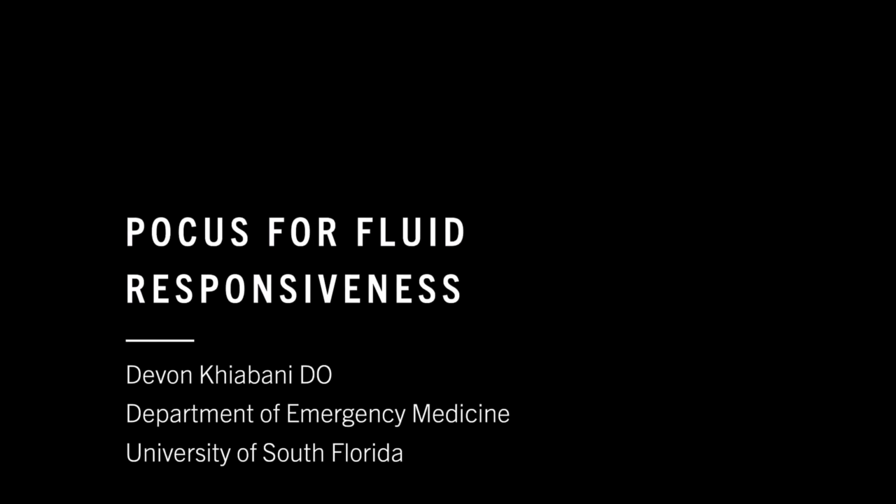I'm an EM physician with the University of South Florida, and today I'll be talking about POCUS for fluid responsiveness. This talk focuses on using ultrasound to answer a very specific question. Will this patient increase their stroke volume if I give fluids? We are not asking, is the patient dry, but rather where they are on the Frank-Starling curve. So POCUS allows us to shift from a static surrogate of volume to a dynamic assessment of flow.